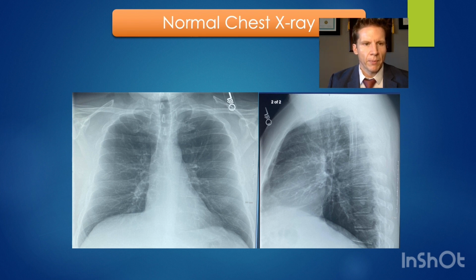There's no significant patient rotation. The spinous process is about equidistant from the medial edges of the clavicles, and the lungs are adequately expanded. We've got 1, 2, 3, 4, 5, 6, 7, 8, 9 posterior ribs. So now moving on to the support lines and tubes, there are none. I don't see any abnormal foreign bodies or metal objects or any tubes placed.